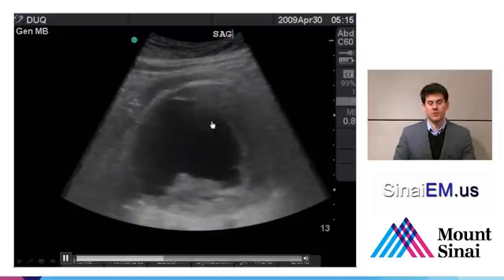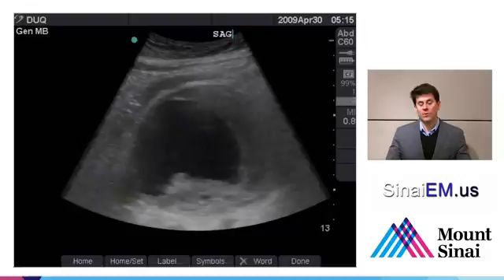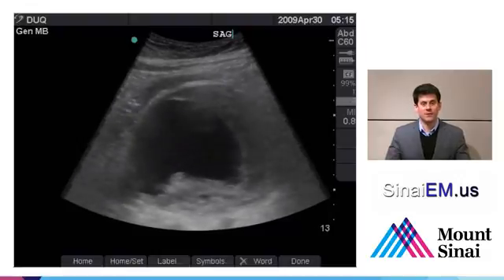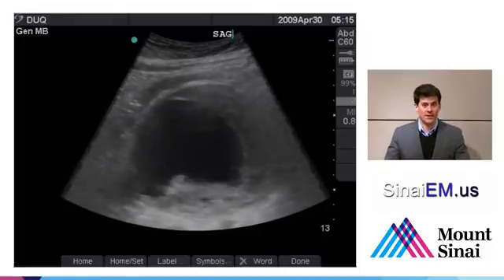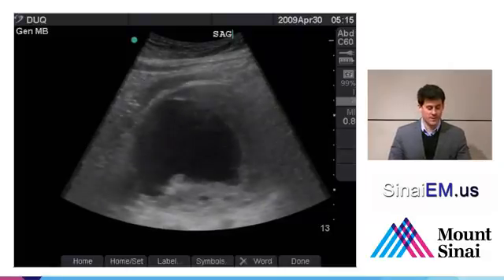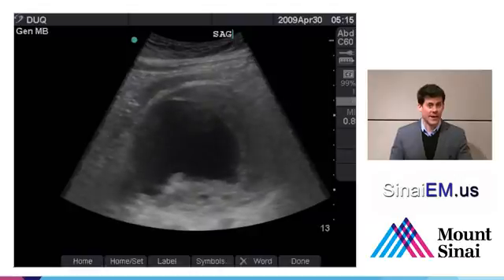That's not where you want to measure. Even though the inner caliber is where the blood's actually flowing through, you want to look at the outer diameter because the outer diameter of the aorta is what responds to the pressures. And the larger the diameter, the greater the pressures going across the aorta. So the prognosis and the surgical interventions are all based on the outer diameter.